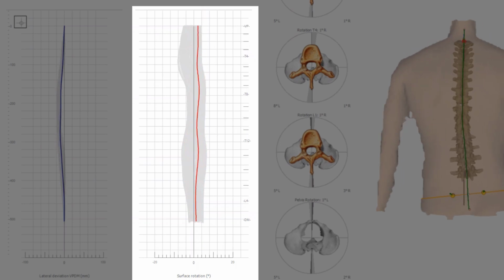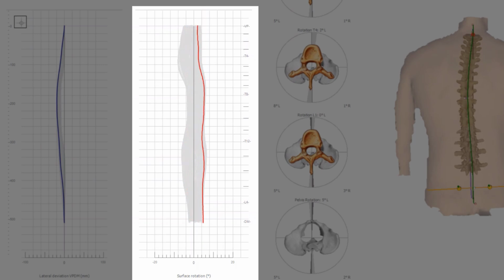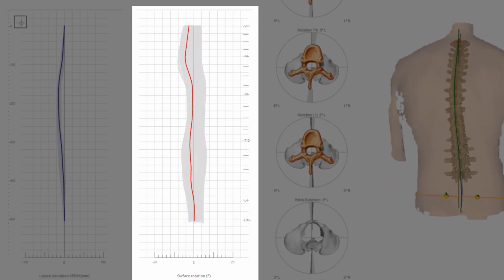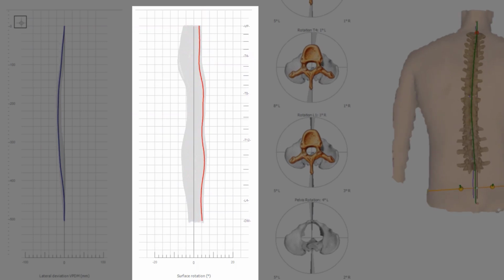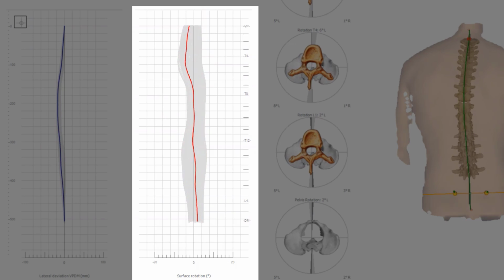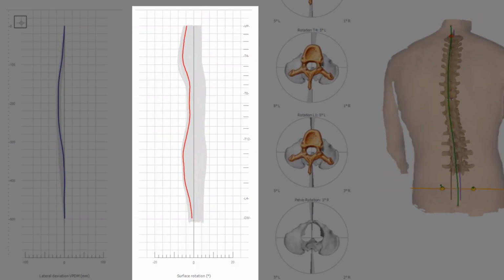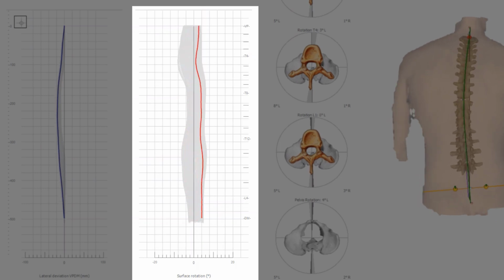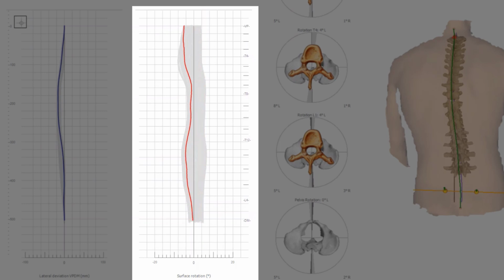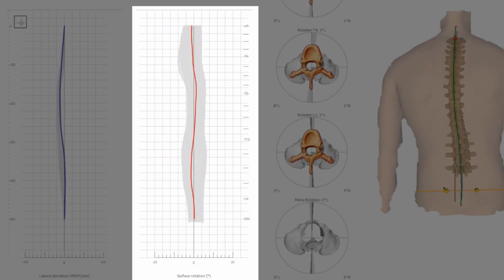The graph shows the value currently valid in the timeline. The gray area behind represents the total range of motion measured in the surface rotation over the entire length of the spine model. With the ulterior motive that both eyes and feet will always adopt this orientation, this graph provides some important information about global and segmental rotation asymmetries. In many cases, symmetrical rotations around an asymmetrically positioned starting point can be observed here in particular.